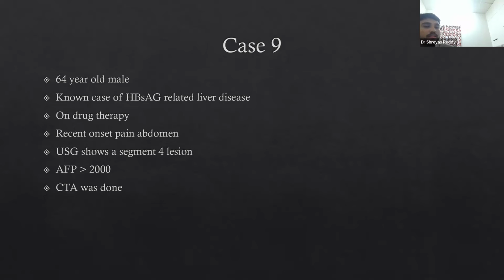What would you think of that lesion as? So now you are clear that it might be an HCC. What other things will you think of if the AFP was not given? Dysplastic nodule. Excellent. It's a regenerative nodule or a dysplastic nodule. What is the best imaging modality to differentiate between a regenerative nodule and an HCC? CT or MRI, both will help you.